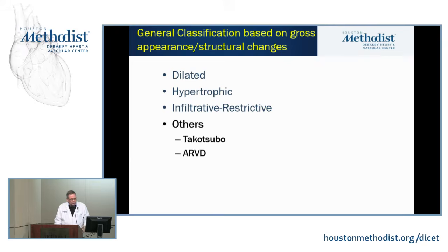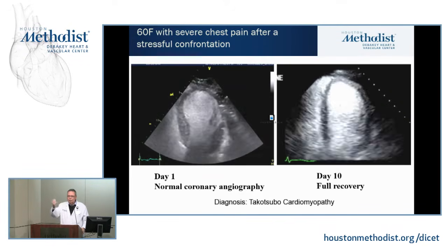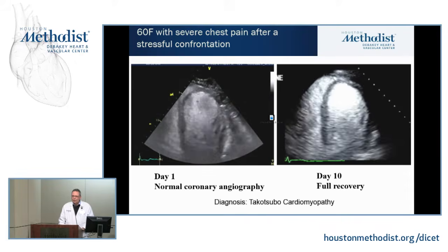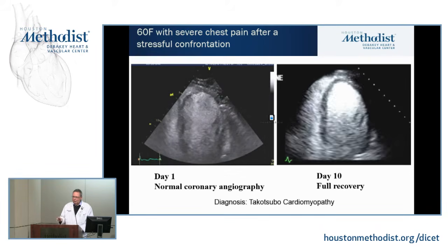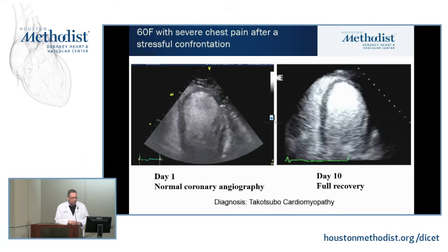A couple of last things, Takotsubo. I'm not going to spend too much time because we do see this quite often. I think everybody here is tuning to it. I come in as the reading attending and already the fellow had put in suspect Takotsubo. So you guys do a good job of that.